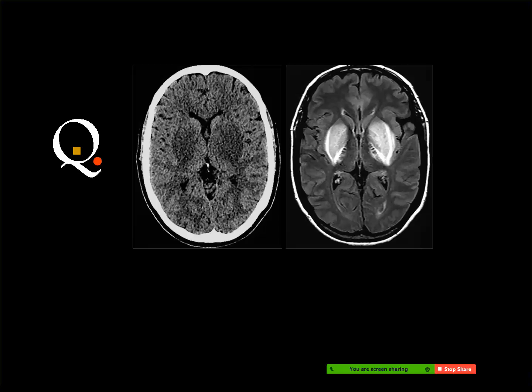Basal ganglia infarction. Bilateral basal ganglia infarction is frequently seen when the internal cerebral veins are thrombosed. But here you do not see any sign of internal vein thrombosis. All we can say here is that we have bilateral, almost symmetrical basal ganglia lesions, and these are subject to a big list of differential diagnosis.